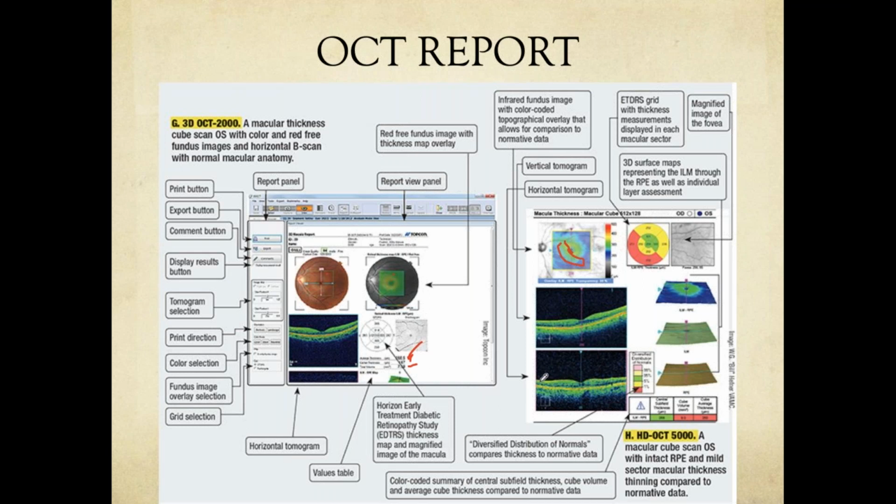You see, you do not have evenly distributed cystoid spaces all around the retina in the same plane. Do you understand? Most of the cystoid edemas are distributed along the same plane, just over the ISOS junction. Same thing happening over here, while the rest of the retina looks normal.